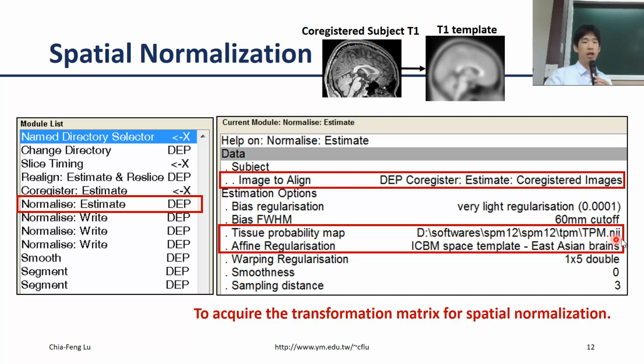To me, it's actually the file path for my computer, but not for yours. You definitely need to make sure that the TPM pathway is right. And another one is this one, because we actually acquire data in Taiwan. Taiwan is the eastern country right here.